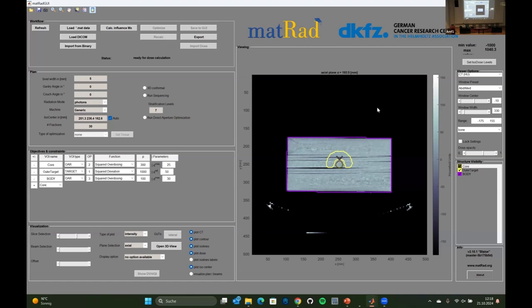You see this patient is kind of boring. It has always the same, but you see that the isocenter marker switches from an X to pointing either downwards or upwards in the direction where the isocenter is. So this patient is boring, very symmetric, has very few organs and a giant tumor in relation. But that's a good thing to start with, so we are not overwhelmed with what we are planning.